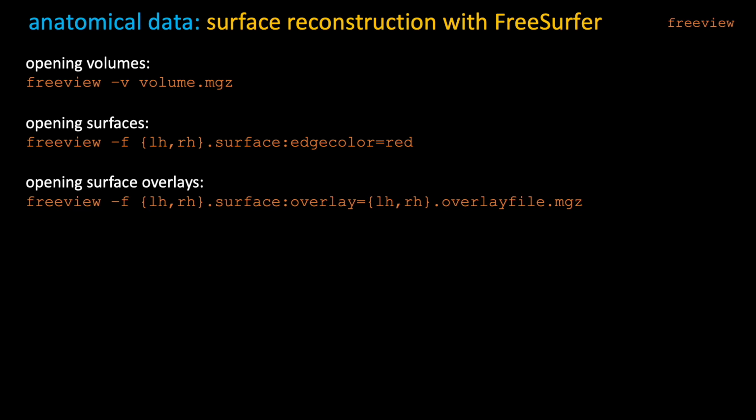In general, FreeView is great. You can set up the commands for future use that you basically just copy paste with a whole bunch of different parameters, how this data will be displayed for you. You can even make it do automatic screenshots for you while you are away from your computer. It's a really great tool once you figure out how to use these crucial parameters. And the best place to start is the help command that will display all these potential flags and parameters for you. So I highly recommend playing with that.